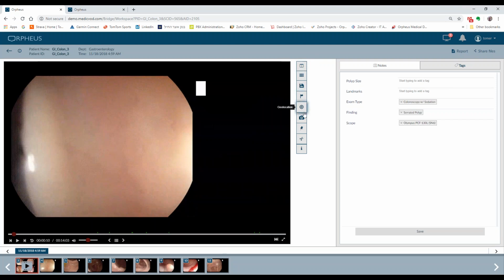The buttonology here on the right of the viewer is context related. So based on whether it's an image, video, or audio file, you will see perhaps different buttons. Most of the buttons will be consistent across the file types, like this side-by-side, mosaic. These are probably things that are not activated or not part of the current version that you have, but we will make plans to upgrade you to the latest version.